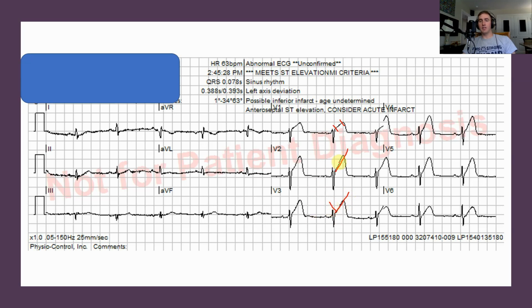He says when you see the ST segment start to straighten out, going from concave to more straight, then that's some of the earliest changes you will see in a STEMI. So they ended up activating the cath lab on this patient, obviously, but there was ST elevation everywhere. There was obvious ST elevation. The J point is right here, and you can see there's many millimeters of elevation in V2 and lead V1.